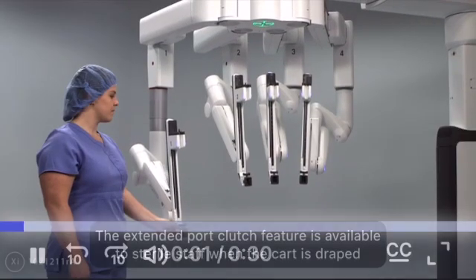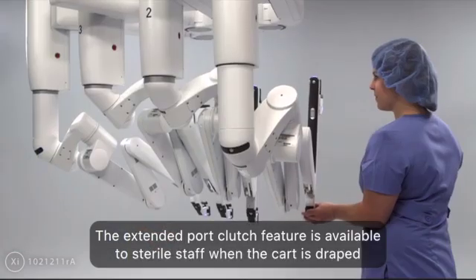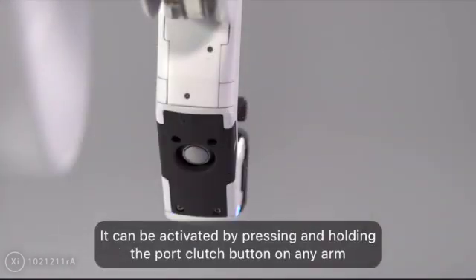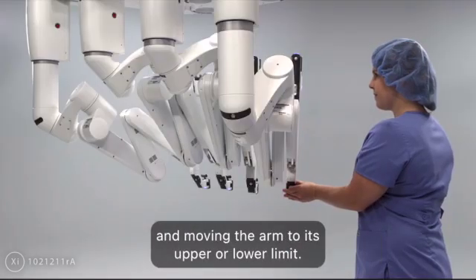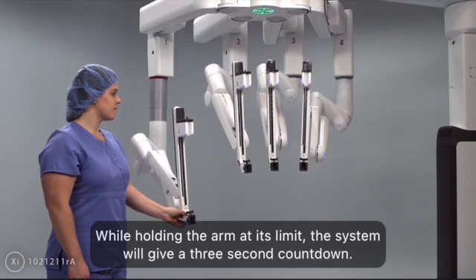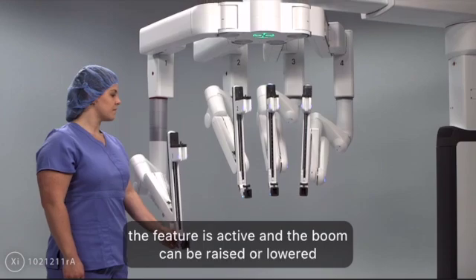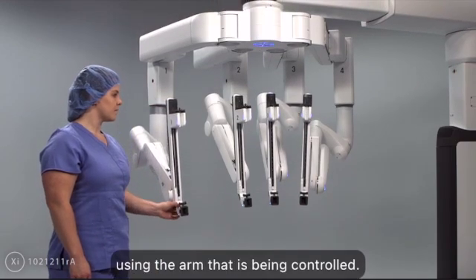The extended port clutch feature is available to sterile staff when the cart is draped or non-sterile staff when the cart is undraped. It can be activated by pressing and holding the port clutch button on any arm and moving the arm to its upper or lower limit. While holding the arm at its limit, the system will give a 3-second countdown. After the countdown, the feature is active and the boom can be raised or lowered using the arm that is being controlled.